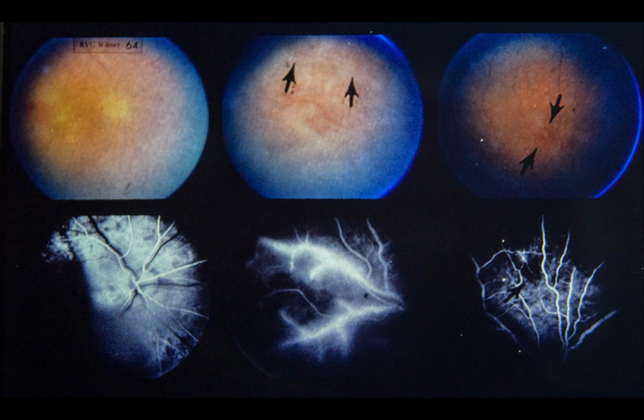the disc. Comment: this patient was followed for 6 months with no improvement in visual acuity despite substantial clearing of vitreous hemorrhage. Decreased vision was apparently due to vascular occlusions at the posterior pole. We also saw a patient with Dr. Ronald Michaels who demonstrated multiple retinal vascular occlusions following intravenous narcotic injections.